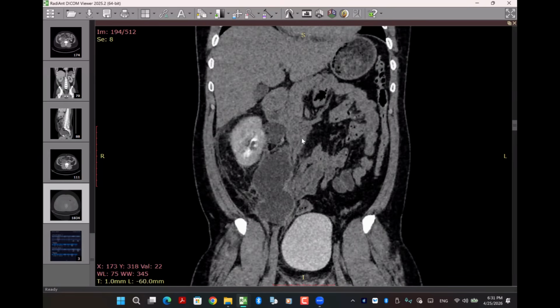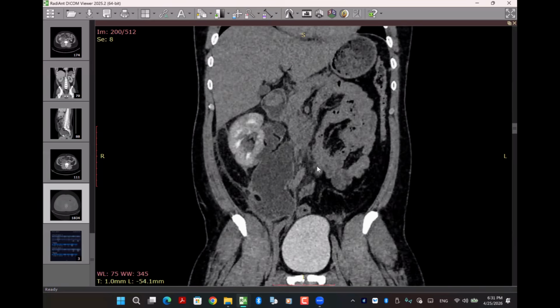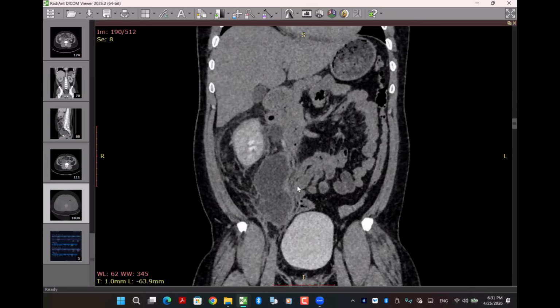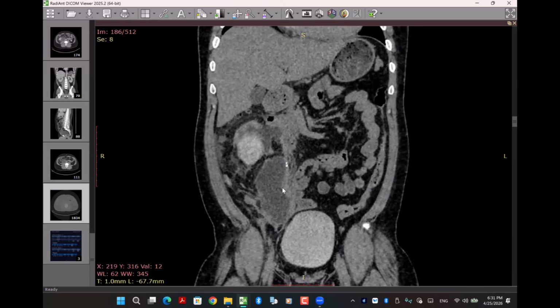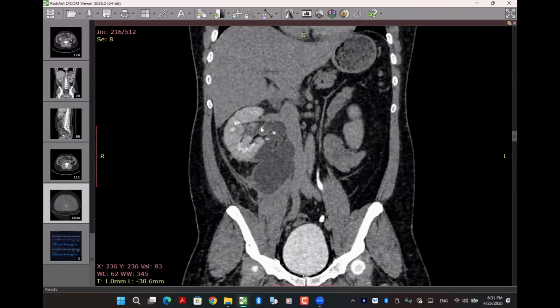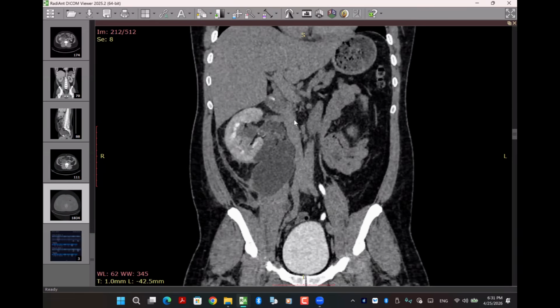Infected hematoma, post-ESWL. They were suspecting this could be a urinoma, not a hematoma. Okay, thank you. He was needing specific questions: is that compromised parenchyma or not, and is that an obstructed ureter or not?